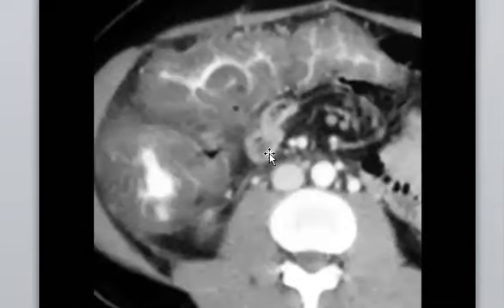So you know that maybe there is some submucosal edema or hemorrhage. Yes, and in the CT it is much easier with marked mural thickening, and you can see that the contrast is like entrapped between the haustra. Perfect, an accordion sign.